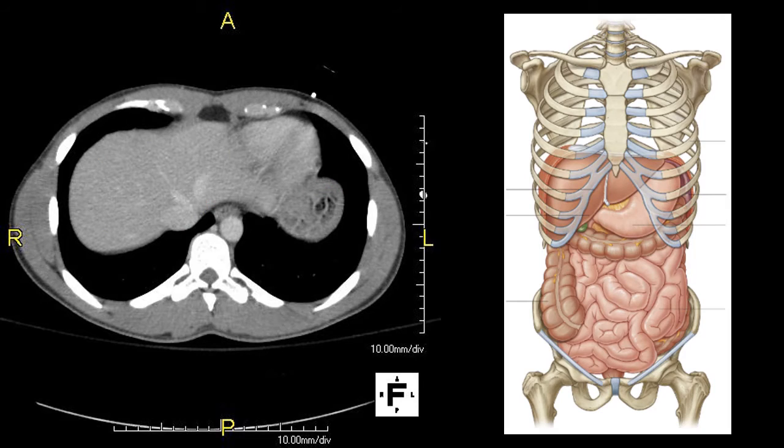If you haven't figured it out by now, the structure we saw first on the right side of the body is the liver. I'll just label that L quickly. And the new structure we found on the last slide is the stomach. And I'll just label that S.